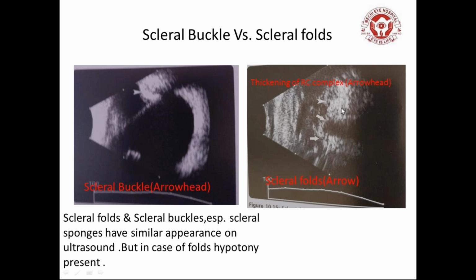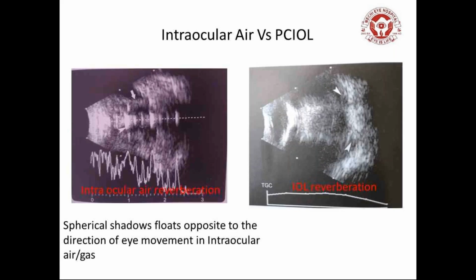Now coming to intraocular air and PCIOL reverberation. Both are reverberation. If there is reverberation due to intraocular air, then echoes float in the opposite direction, against movement. But in case of posterior chamber IOL, there will be with movement.